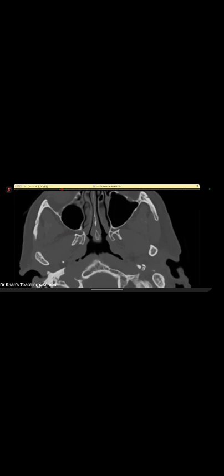So, our aim here will be to learn the anatomy of the pterygopalatine fossa. The pterygopalatine fossa is a landmark or a junction in head and neck radiology. What happens is that there is a fossa here which we are going to describe. Medially, it communicates with the nasal cavity. So this is the fossa where I am pointing out. The pterygoid plates are here. This is the maxillary sinus. And look at this space. This is the space we are talking about.